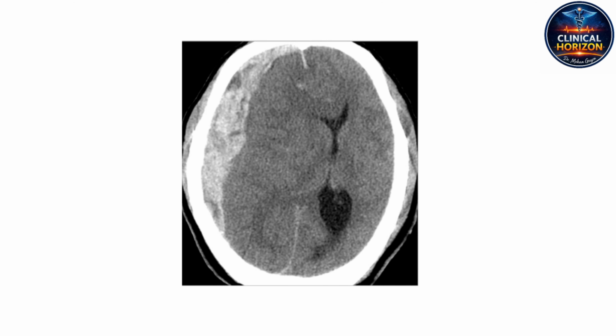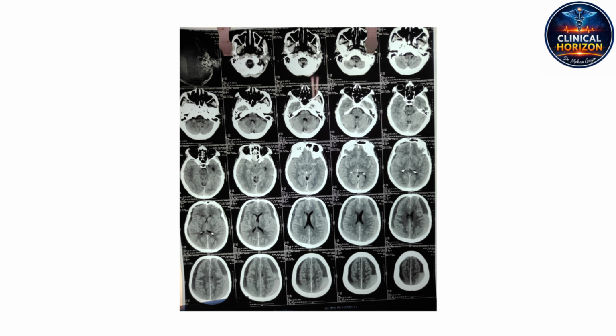Which brings us to a crucial variation of this pathology in scan 6. We are looking at bilateral subdural hematomas, crescent shapes compressing both hemispheres. But the density is not uniform here. It's mixed. Yeah, we see a complex mixture of dark, hypodense regions interspersed with bright, hyperdense fresh blood. This is an acute-on-chronic subdural hematoma, and it reveals a critical clinical takeaway about neural anatomy and aging.